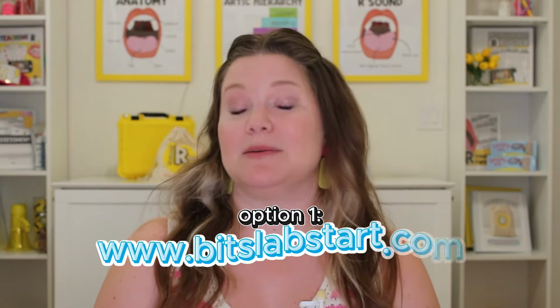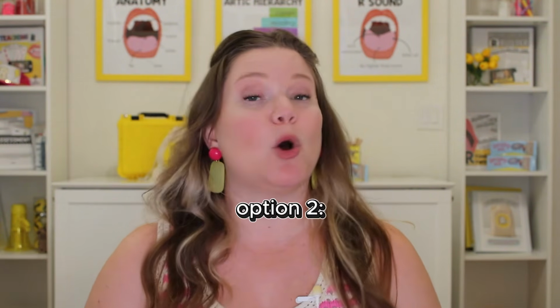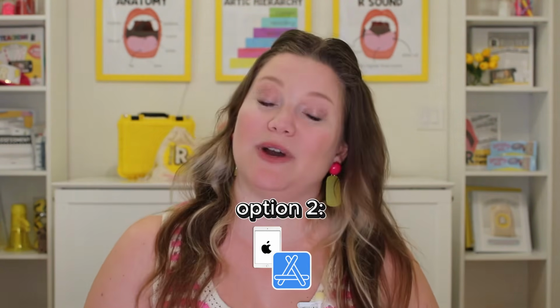First things first, there are 2 places you can get access to the staRt app as of the recording of this video. One of your options is a website, www.bitslabstart.com, and the other is an app only for iPad available in the iOS App Store. Today, we're really focusing on the iPad app since there's a little bit more download instructions.